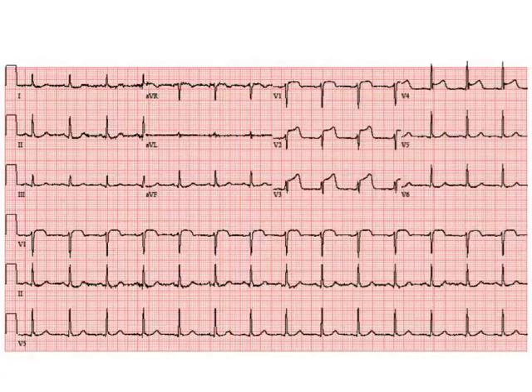This is an ECG of a 49-year-old man who presents to the emergency department with crushing, severe anterior chest pain for the last 1 hour. Let's look at his ECG. Immediately, we see marked ST elevation in leads V1 to V4, which represents acute anterior infarction. Clearly, this patient requires urgent medical care, but we will go through the stepwise interpretation of his ECG.